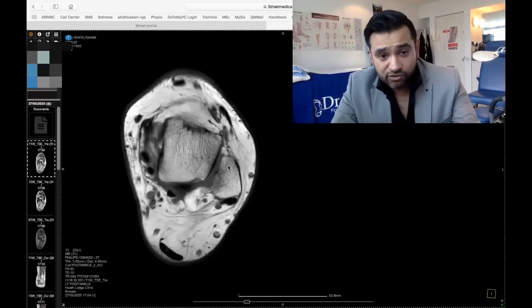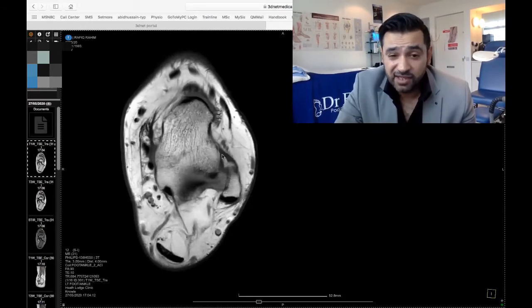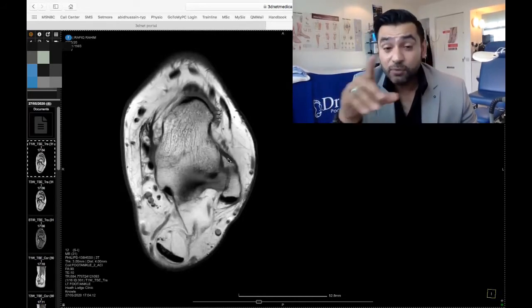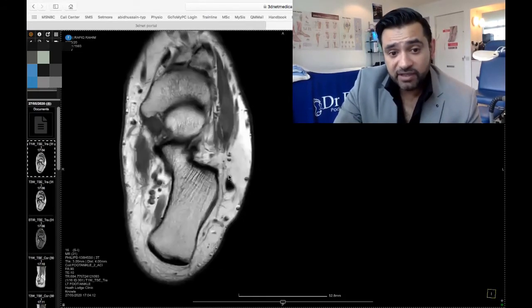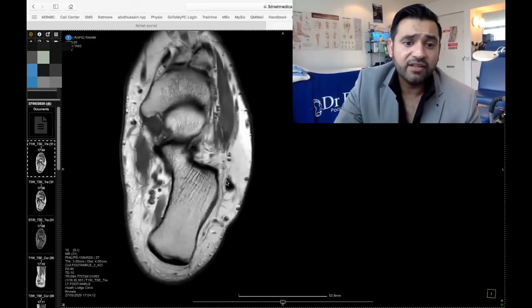The next lateral ligaments that we need to look at are the anterior talofibular ligament, which is just here, and the posterior talofibular ligament. You see it's actually quite a lot thicker, isn't it? This one gets injured a lot. The ATFL is something that I see in so many athletes, and there are many people that function very well without an ATFL. So that's very important to understand. The calcaneofibular ligament is actually further down, just behind the peroneals, and it just runs there.